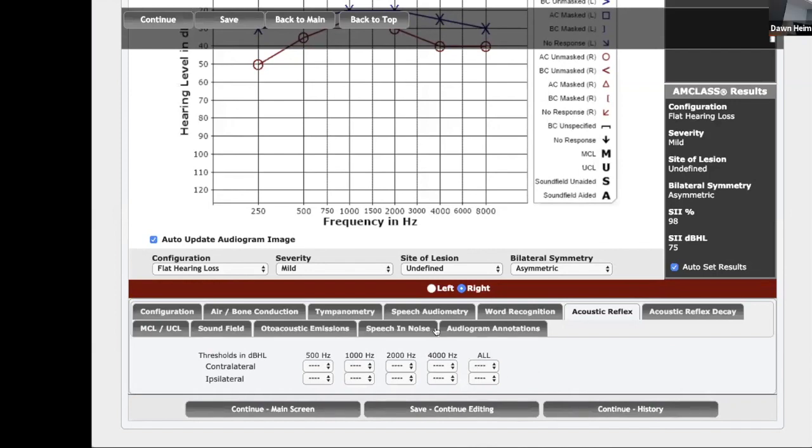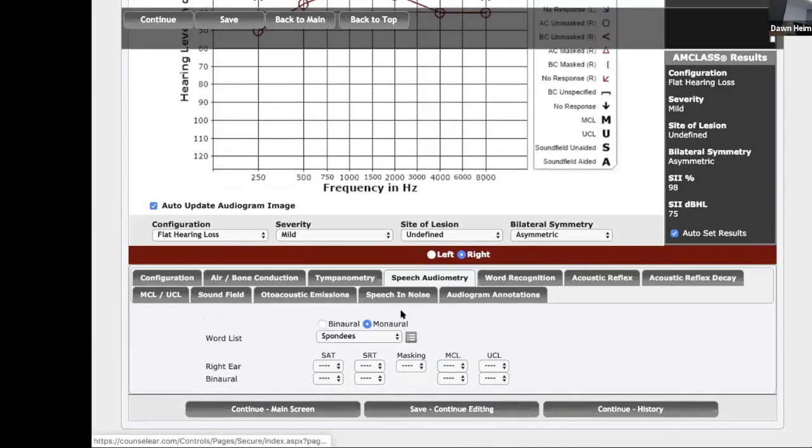Anyway, that's what happens. When it comes to speech audiometry, I don't know if Brian just doesn't want to get political because he's such a nice guy. I don't know if he'll ever see this video someday, but I highly doubt it, I hope not. But speech reception threshold, or is it speech recognition threshold? Whatever you want to call it. And you can choose ID'd body parts, ID'd Spanish, and so on.